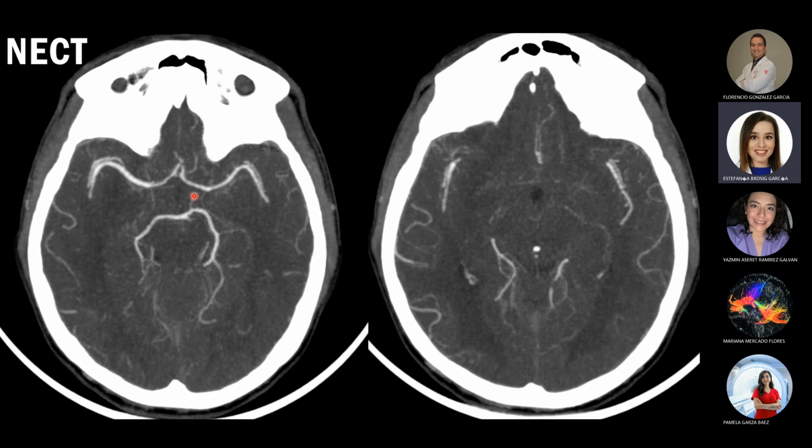and give us an etiology. After careful review of all the intracranial vessels that we can see through imaging, we didn't see any dilation, saccular or any other form, and no other vascular malformations that might explain the hemorrhage. Here we can see the anterior cerebral artery with the anterior communicating, which is the first location that we might search.